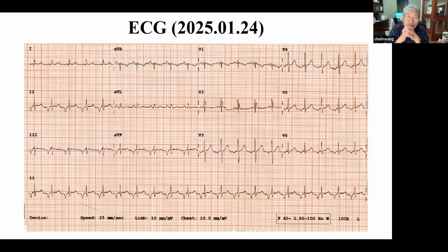Is that what you guys are thinking? So how do we interpret this QRS duration now? What does the QRS look like? The patient has a right bundle branch block morphology, right? Correct? V1, V2. Okay, rSR prime.